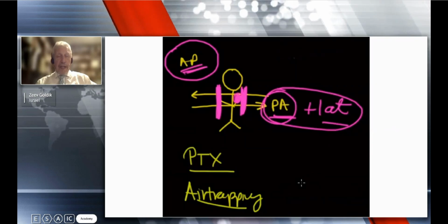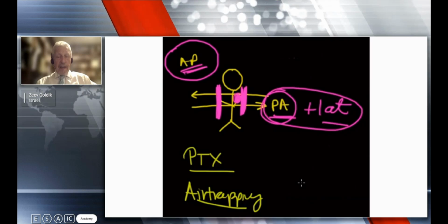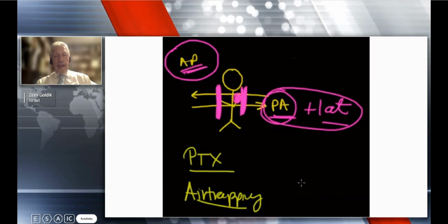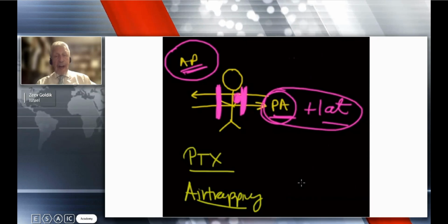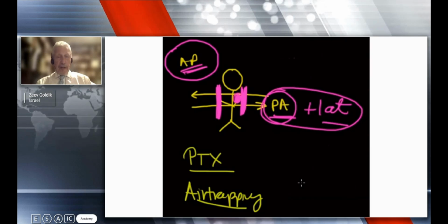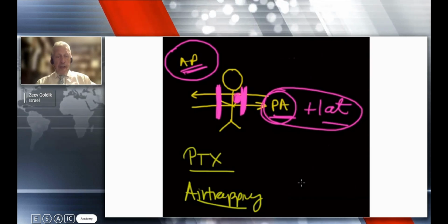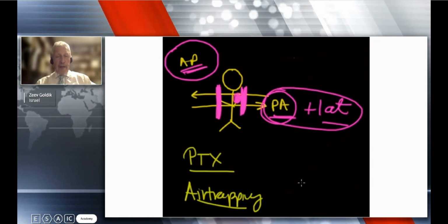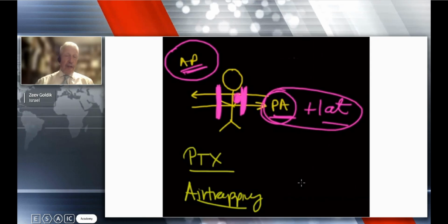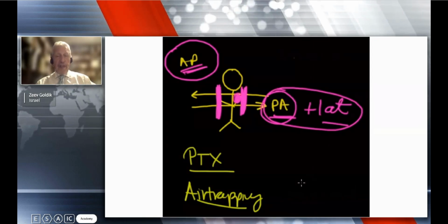Most of the chest X-rays taken with a mobile unit at the different wards outside the radiology department are anteroposterior. When the patient comes to the radiology department, we have this luxury situation that we can do a better quality chest X-ray.